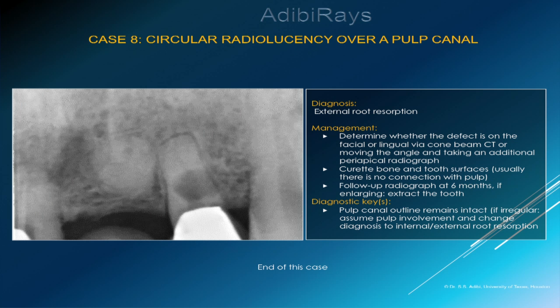The diagnosis is external root resorption. Determination of the location of the defect is necessary first. It may be on the lingual or facial aspect. It can be determined by either multiple radiographs at varied angles or cone beam computed tomography.